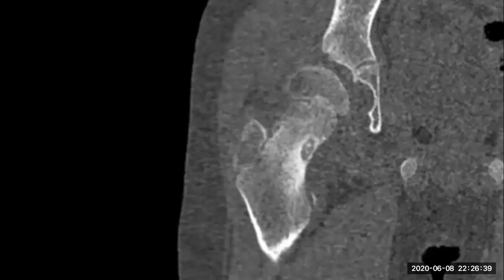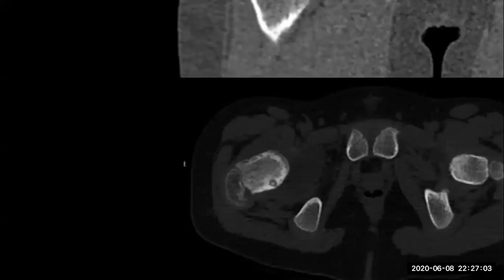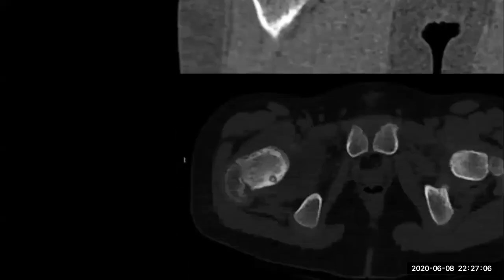There's a nidus. We see the nidus, a radiolucent area with calcification inside, and this is the sclerosis around the nidus. If the nidus is less than 2 centimeters, we call it osteoid osteoma; otherwise, osteoblastoma. This is the coronal reconstruction, you should mention that, Nofal. And this is the axial reconstruction, and you see the nidus and the calcification.